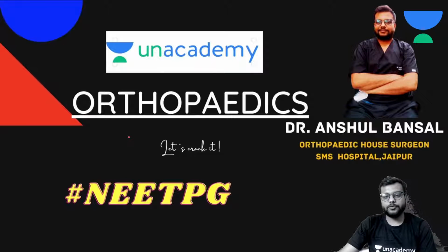In today's YouTube live session, we'll read about the X-rays of the upper limb. So it's basically a revision type of session, very interesting and very high yielding, in which we'll study upper limb orthopedics with the help of the X-rays.